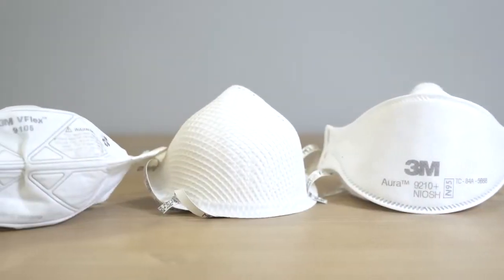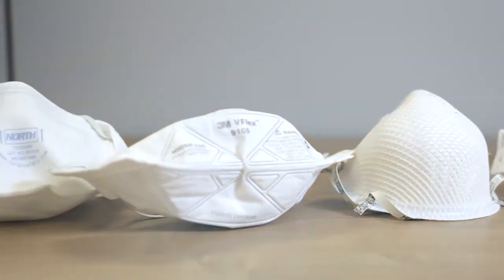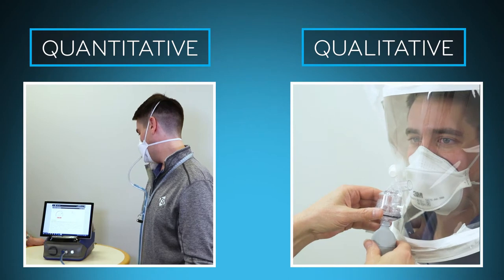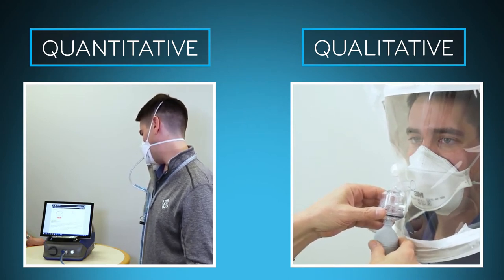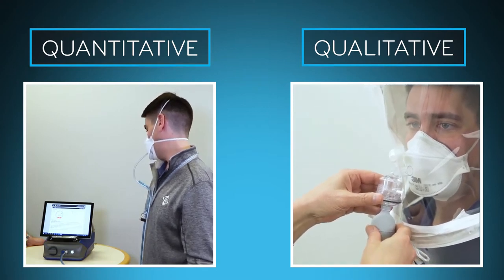Are you looking for an accurate, easy, and less time-consuming way to fit test your employees' respirators? This video compares the two available respirator fit testing methods, quantitative and qualitative, as described by OSHA, and shows how quantitative methods allow you to provide a more beneficial fit test in less time.